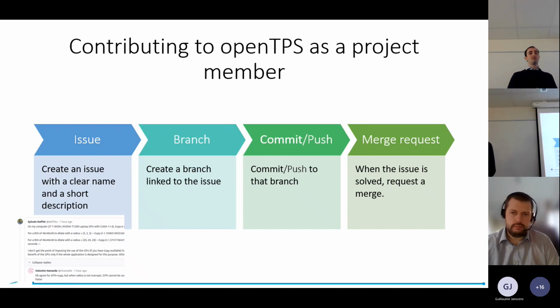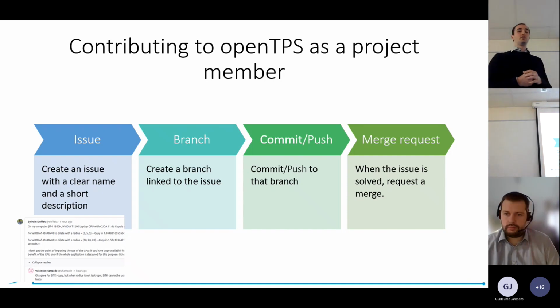And from the web interface, you can do this very easily. There is a button to create an issue, and then there is a button to create a branch linked to that issue. And then you work in this branch. And when your work is done, you can just request your work to be merged into the master branch.